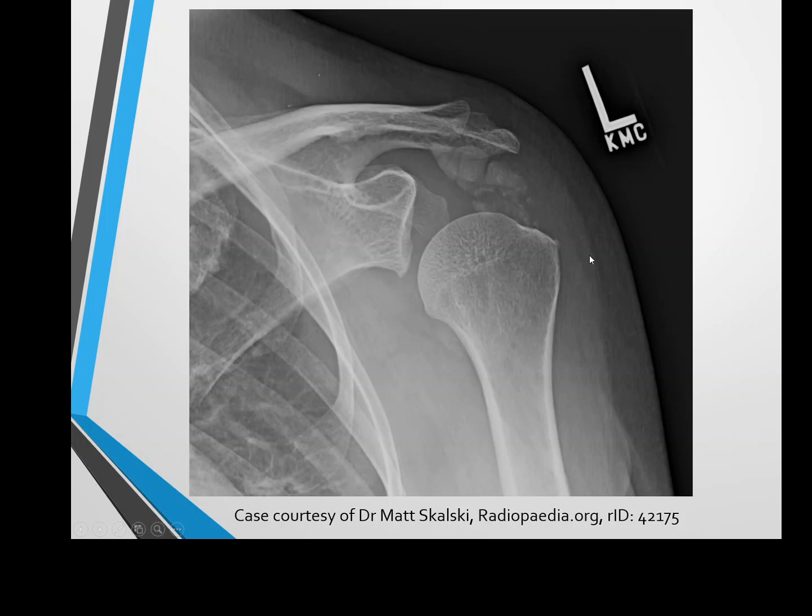And here we have a very large HADD of the subacromial bursa. This image in particular has got an enormous subluxation of the glenohumeral joint. To be honest, this is going to be pushing a full dislocation of the joint with massive involvement of the glenohumeral joint and the subacromial space, and all of this calcification just here is the subacromial bursa. So again, almost impossible to differentiate that from the supraspinatus tendon.